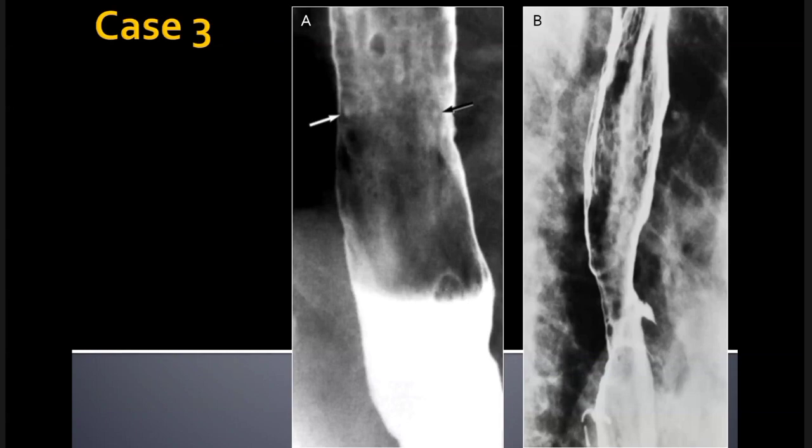Yes, ma'am. The esophagus is dilated with mucosal granularity and irregularity, multiple erosions and small collections of barium, giving it a velvety appearance and suggestive of Barrett esophagus, which is columnar metaplasia of the normal squamous epithelium of the distal esophagus. It will be confirmed by endoscopy and biopsy because of the increased incidence of carcinoma. Excellent, very good, well done. That's spot on.